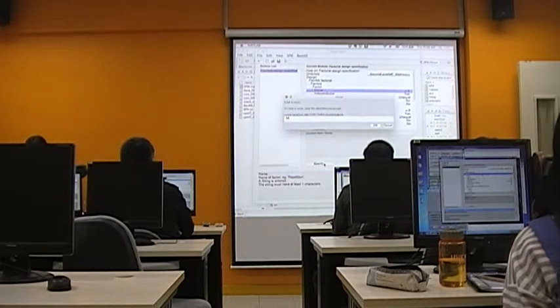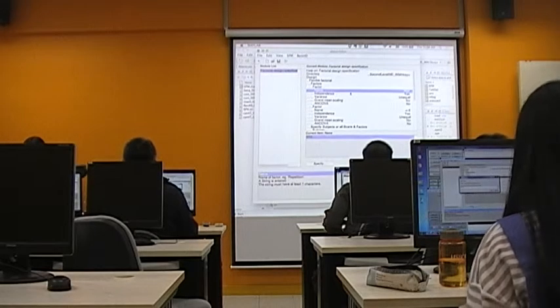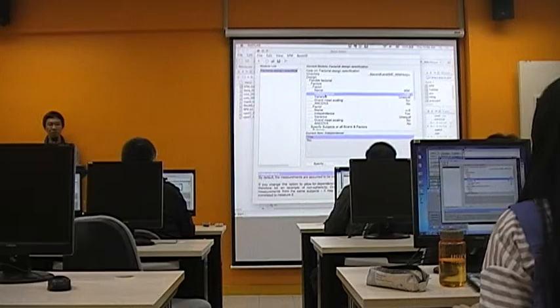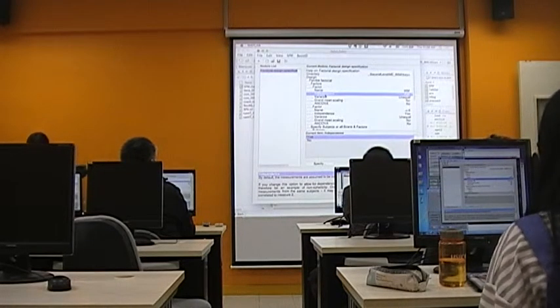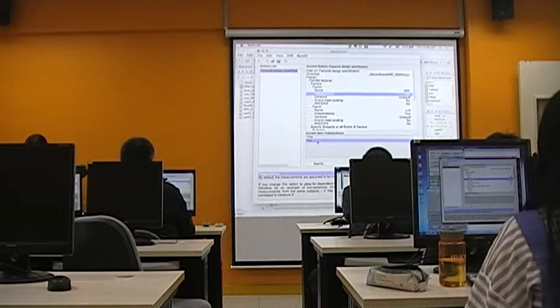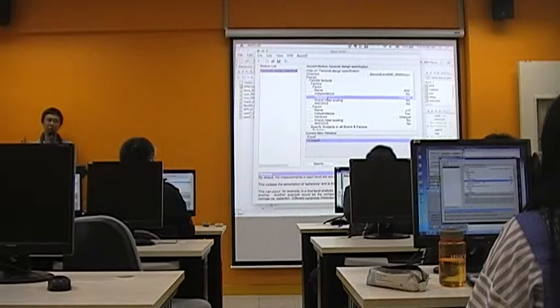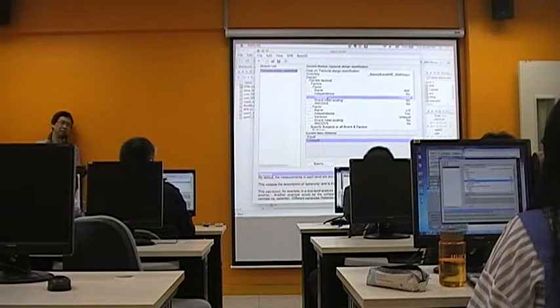I just quickly use the soft form, and let's say because it is a within subject factor, the observations are not independent from each other, right? So we choose no, they are not independent. And then supposedly the performance for the one back condition and the two back condition should have equal variance, right?